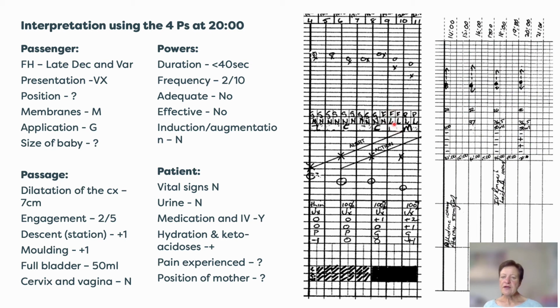Even if the fetal heart was not recorded with a CTG, as it is here, we can see that the difference between the before and after contractions fetal heart becomes bigger, and this looks almost 20 beats per minute. So it's clear from just looking at this part of the fetal heart recording that there's a big problem. But then we see also that there is decreased variability, and there are late decelerations, which becomes very worrisome to us. That is an abnormal pattern of the fetal heart.